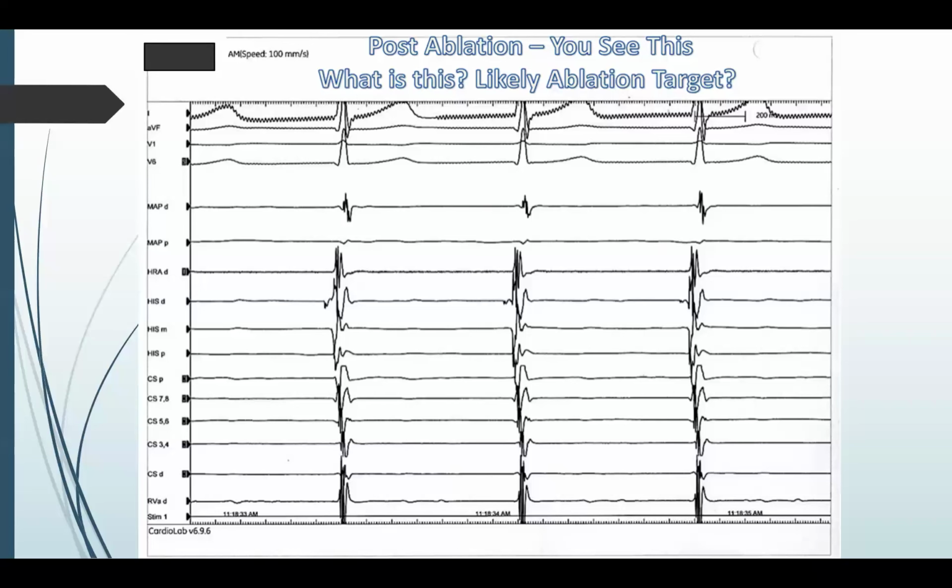Hey, good morning. Yeah. Let's see. I'm not fully certain, but let's take a look. Is the patient in sinus rhythm? No, I don't think so. I think it looks like a junctional rhythm to me. Okay, I agree with that. That is a junctional rhythm.